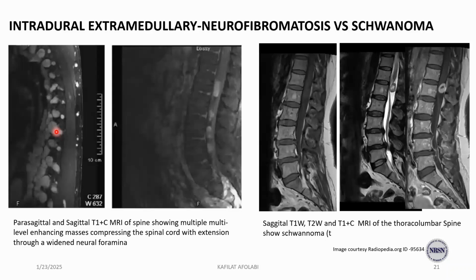If you remember, during our quick review of the anatomy of the spine, how the keyhole appearance of the neuroforamina was, you could see that in this lesion, we can hardly make them out.